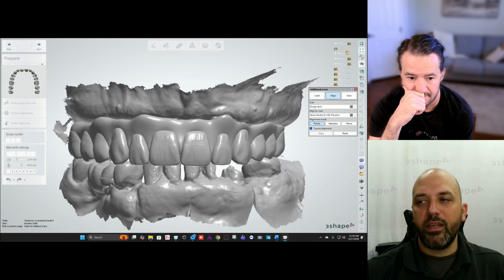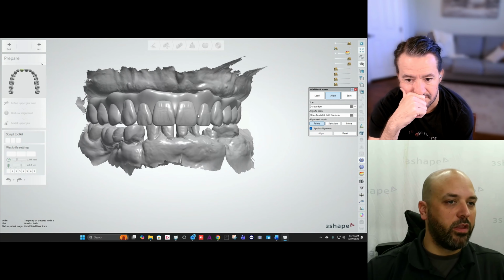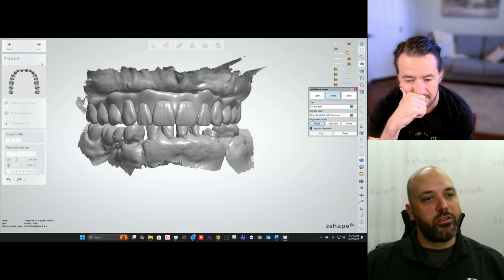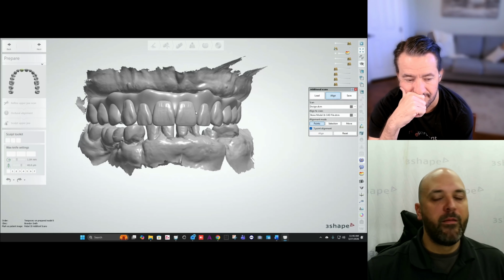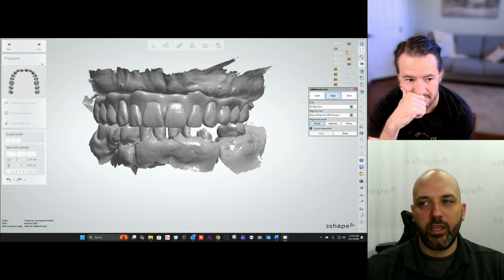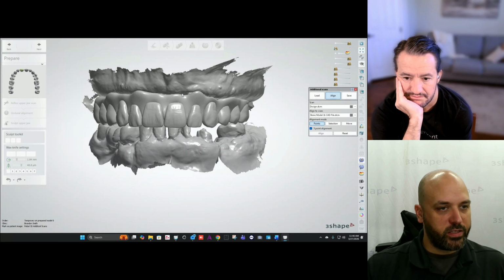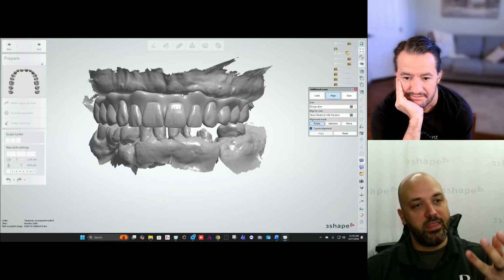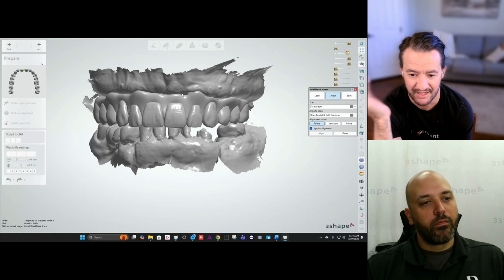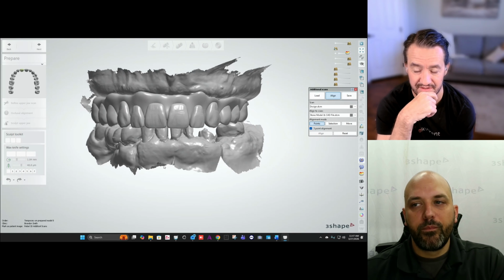The nice thing about this is it gives me the ability to change some files around on the back end, and I can then use the denture workflow to move this stuff over and align it. Because this file that I actually aligned is not me scanning in the bridge that I designed before I took it in. I actually pulled this file from the original case's CAD file. So it's legitimately the actual design, the high resolution CAD design that you're starting from to align back to the intraoral scans.